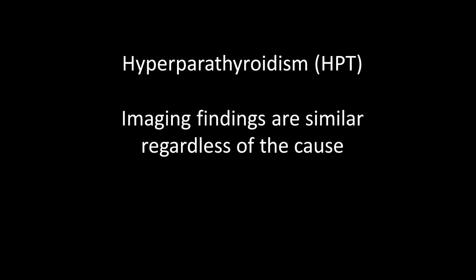So remember, all the different bone resorptions that I just showed in all these different locations in the body will be seen not just in patients with chronic renal disease, but occasionally will also be seen in patients with primary hyperparathyroidism.